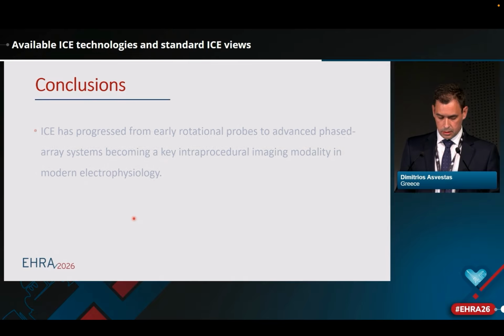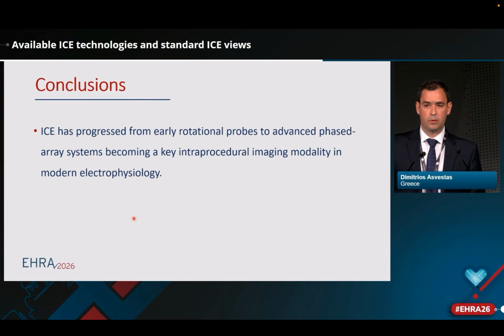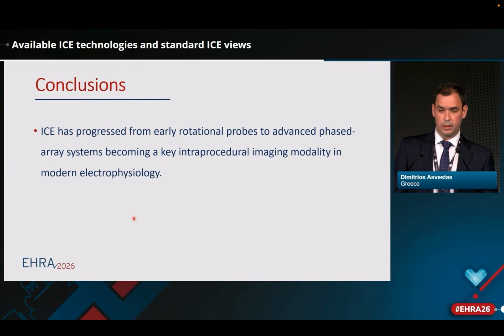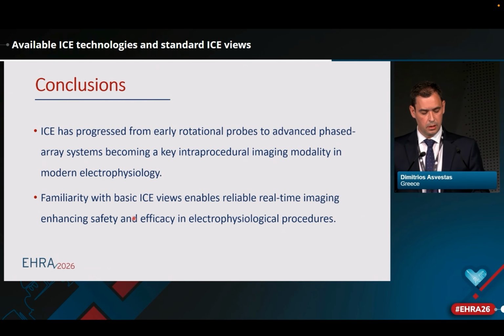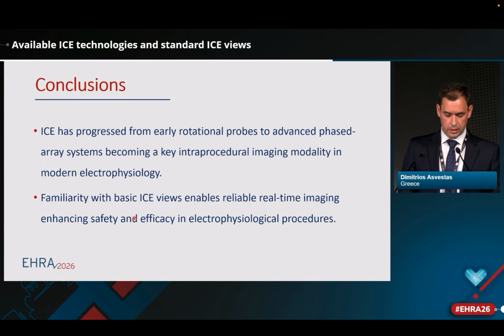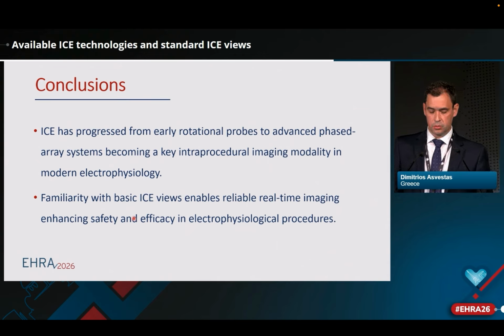To summarize, ICE has progressed from early rotational probes to advanced phased array systems, becoming a key intraprocedural imaging modality in modern electrophysiology. Familiarity with basic ICE views enables reliable real-time imaging that enhances safety and efficacy in many EP procedures.